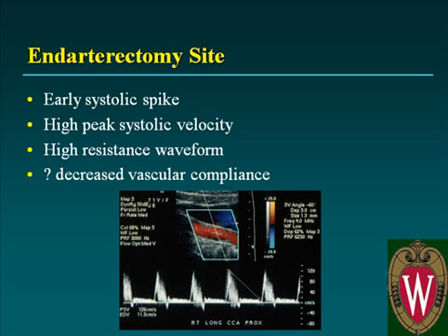Velocities and the waveform character can change radically at the endarterectomy site. Oftentimes this has to do with decreased vascular compliance, but the presence of both elevated velocities and high peak systolic velocities and a spectral broadening phenomenon is common at the site of prior surgery.